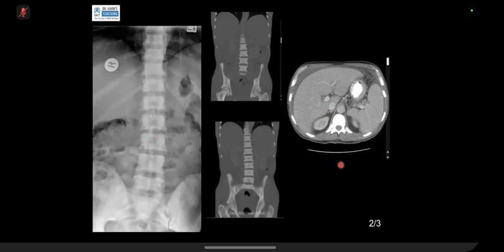In the CT scan, I can see that there is diffuse sclerosis of the vertebral bodies and also pelvic bones, also involving both proximal femurs. I can see in the axial images there is perihepatic ascites. I can see that there is splenomegaly, and it could be hepatosplenomegaly. In my routine practice, I will check the rest of the images. And there is some lymphadenopathy also.